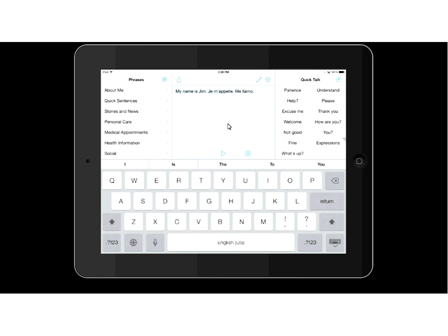Okay, the first time it didn't do that. Let's try the second time. I promise you this worked yesterday when I looked at this. It should be set to automatically recognize. But I guess you can see this feature may not be the most accurate of this group. Let's try it one more time. Nope, still not working right, but that's okay. I mean, that's the idea behind it.